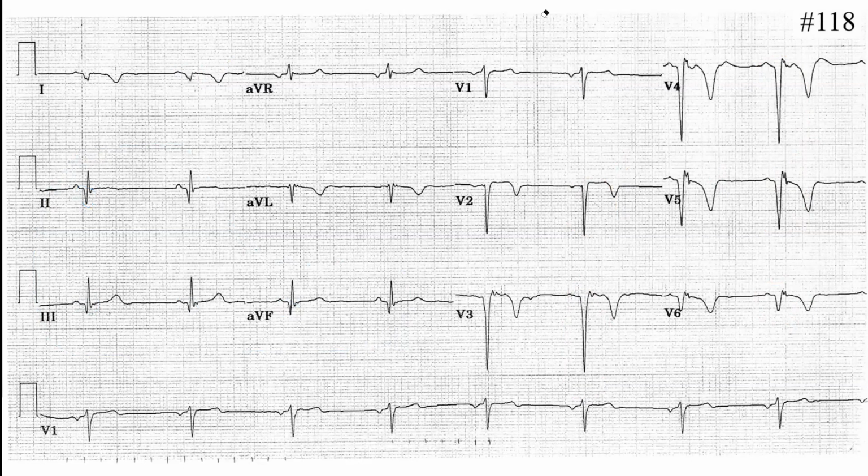Sorry, could you just repeat again? It's inferior. We do see that inferior, but that's an old one, because we have only Q wave, no ST or T changes. And which one is the other one? Another one, V2, V3, V4, V5, V6, and lead number 1. That's an anterolateral. Oh, okay. And we don't see ST changes, but we do see negative T wave. So this is why we said that's a subacute anterolateral MI. Okay, thanks. All right. Good.